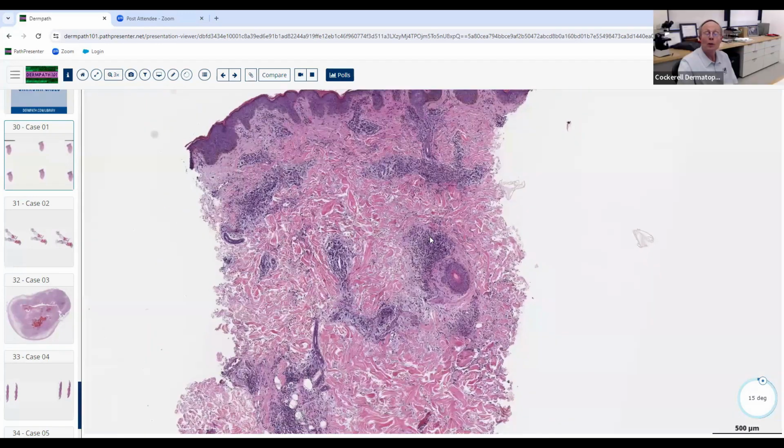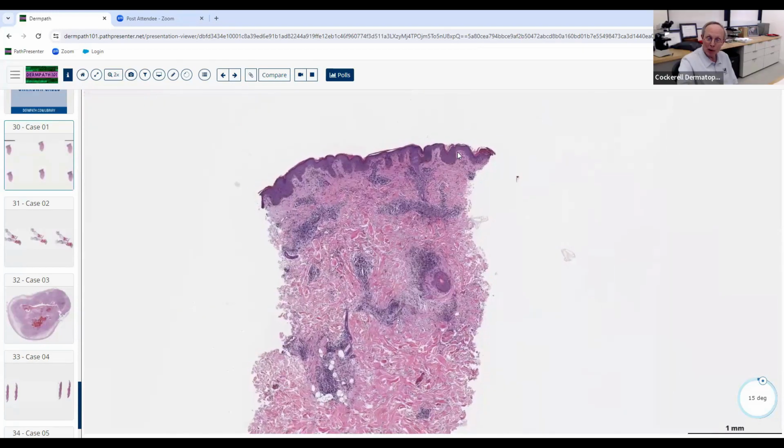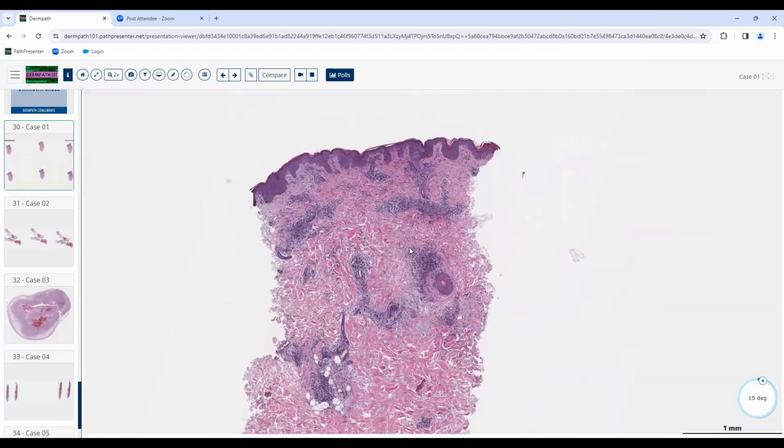So there's one other form. It is lupus, but which form doesn't give you much epidermal change and looks like this with mucin? Now, discoid gives you the epidermal involvement also, right? The follicular plugging. Oh, that's right. So what's this one?